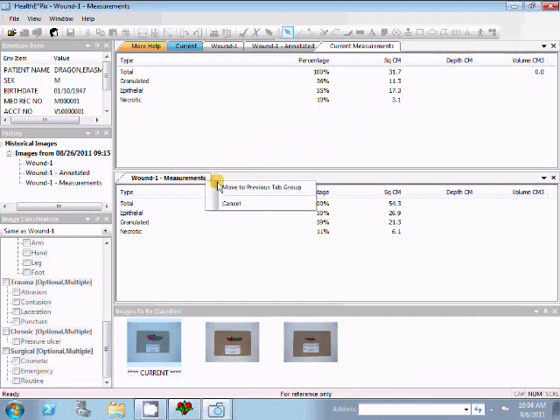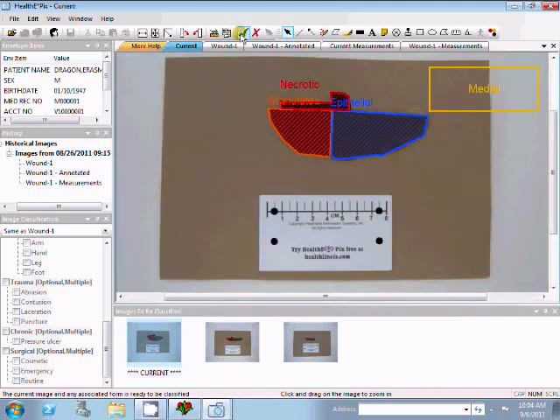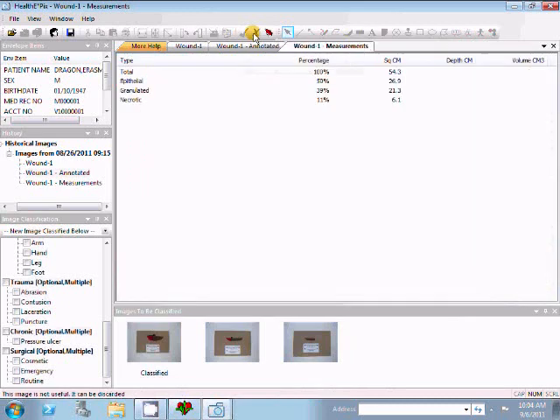When I've finished with any annotations, I click the Classify button in the toolbar. This causes the thumbnail to change from current to classified. However, nothing is complete until I click the Save button. So if for any reason I decide that I don't like the work I've done, I can discard my changes or simply exit the program without saving to start over.